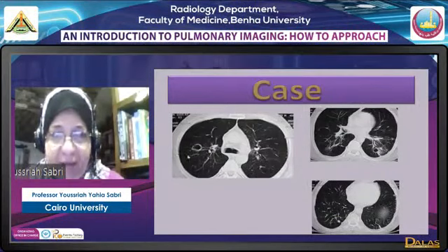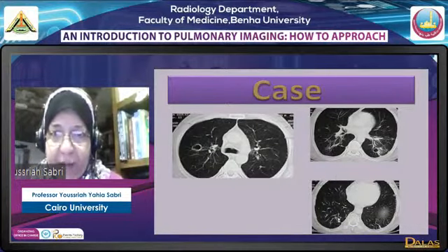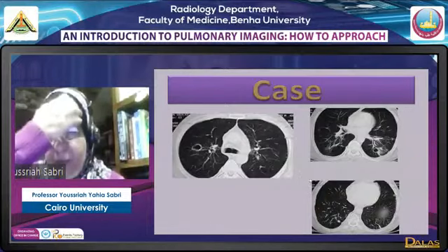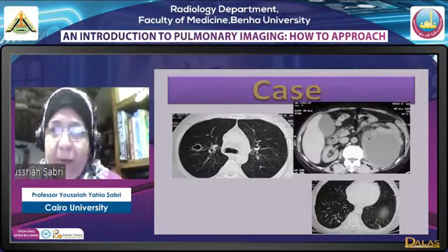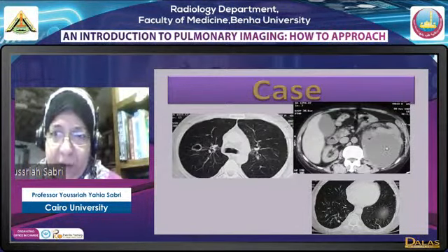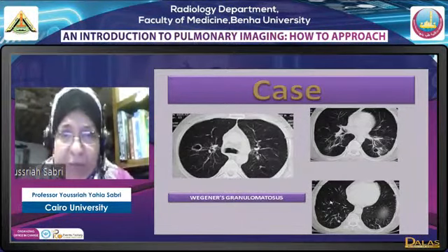Here we have cavity lesions, multiple cavity lesions, scarring and nodules, and we have a parenchymal band on the left basal area here. A parenchymal band is a linear opacity reaching to the pleura. It represents scarring, so we have mostly scarring and nodules, and cavitation. Bilateral and countable. Vasculitis considered versus a post-inflammatory process. Upper abdominal images show a subcapsular lesion related to the left kidney. This was actually a case of Wegener granulomatosis where they tried to take a blind biopsy from the left kidney.